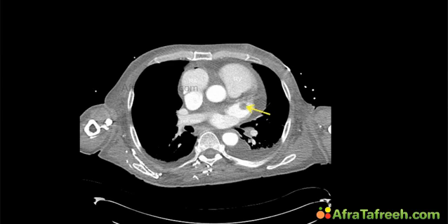This is the CT scan of this patient. Just for your information, here is the left atrium. This is the pulmonic vein. One vein here, this is the left and this is the right. Here is the aorta, the right ventricle, and the right atrium, which is also cut on this plane. And this here is the left atrial appendage, and right here you see this thrombus. So we can diagnose the thrombus also with the help of CT.